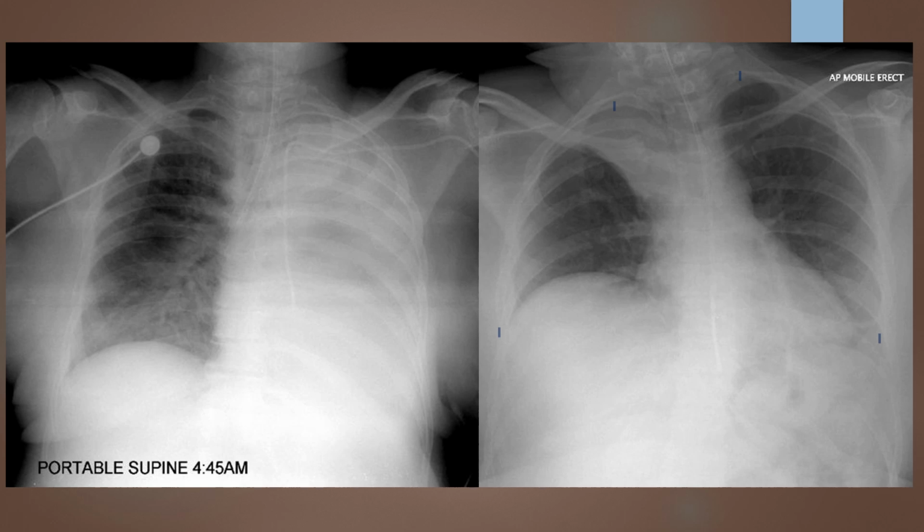It does look a little bit bright to me. That is something that maybe would be able to window and level out. So I would pay very particular attention to my exposure index to see how much more we could optimize this image. So that would help me decide the next step. Now let's go ahead and assume that our exposure index is adequate, so we have some window and level capabilities.